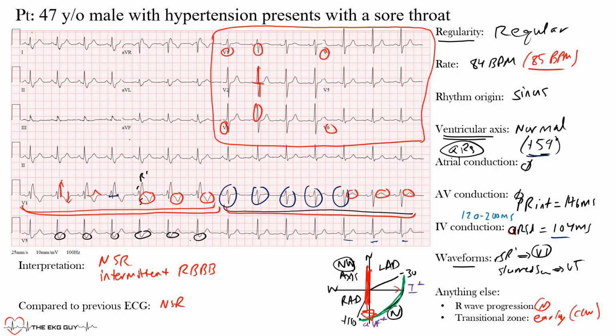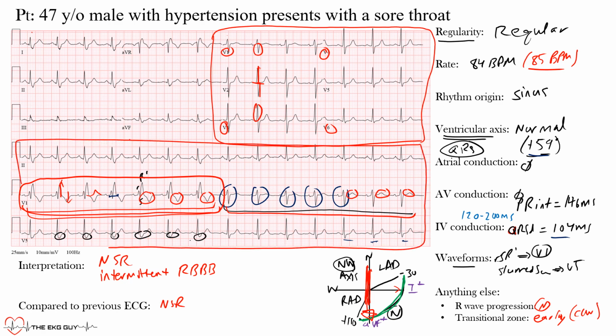Okay, so this EKG shows normal sinus rhythm with intermittent right bundle branch block, and I thought it's quite neat that we were able to capture those first 7 beats showing that. And what it shows is the importance, when we look for axis and everything, of these rhythm strips down here at the bottom, keeping those all into consideration and not only focusing on these 3-second or 2.5-second strips right here. The rhythm strip is very valuable here, and that's why I always want you to look down at them, and you'll notice sometimes that these complexes will change.